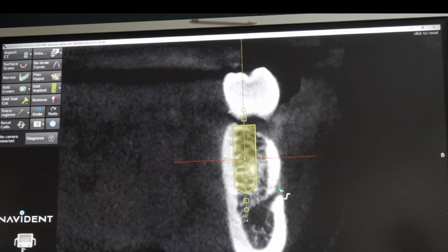Even though mental foramen exits here upper plane, but inside the bone it is down. So that is what the mental nerve exits upwards. From here it goes upwards, right? Inferior nerve only becomes mental nerve, not the reverse, right? Okay. So upwards and buccal.